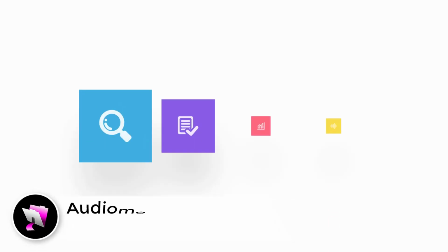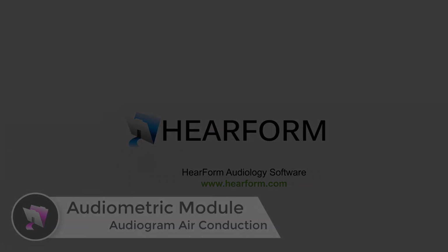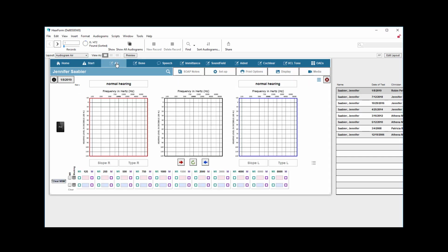Welcome back. This video will explain the Audiogram Air Conduction screen in HearForm Pro. We last left off on the Start screen, but I'm going to go to the Air screen by clicking this button up here. Now that takes me to an area where I can manually input air conduction scores.